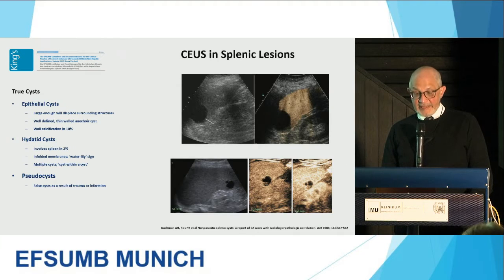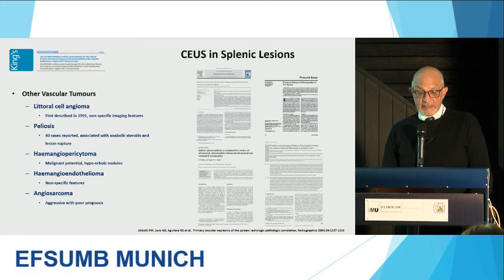True cysts are a little bit easier to make a diagnosis. You probably don't need a contrast-enhanced ultrasound to show the epithelialized true cysts that you can see in the spleen, and the pseudocysts from trauma that you may see some years later after even forgotten trauma. Hydatid cysts, of course, you relate this to the presence in an endemic area, and in the UK the endemic area for hydatid cysts is in Wales, so be careful when you're there.